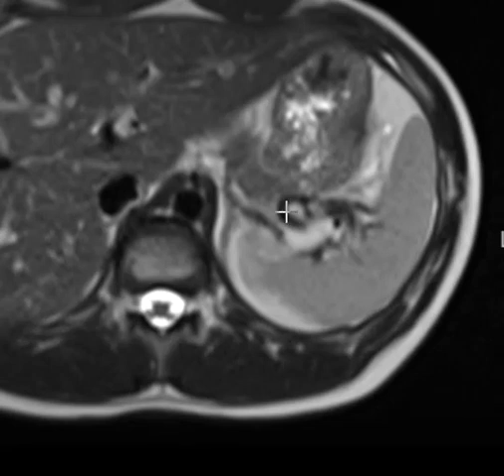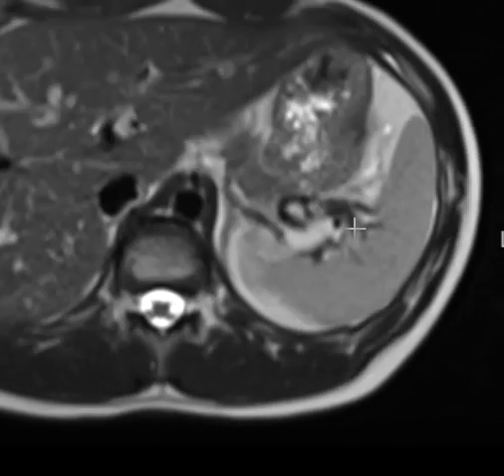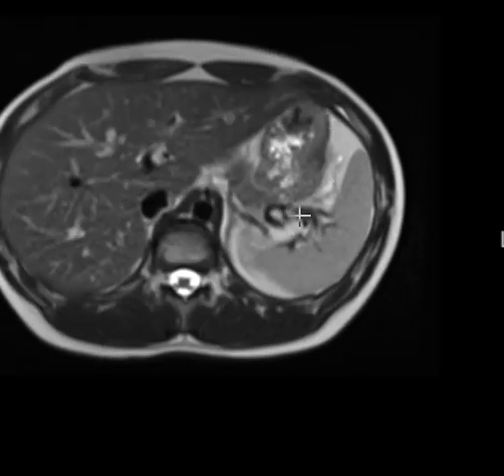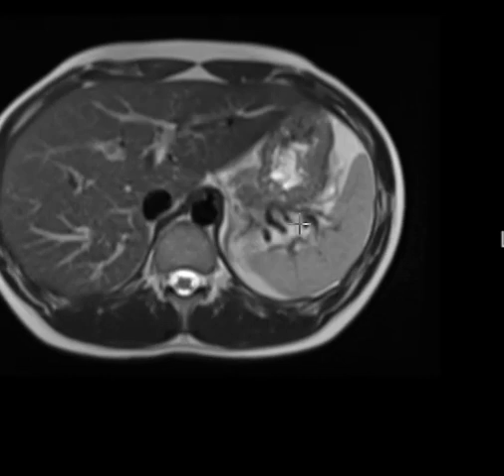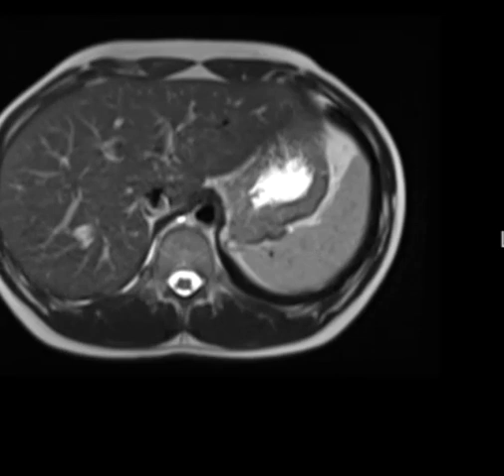We see these dark areas around it. These are the blood vessels. Most of these are the veins. Sometimes when people have problems in their liver, if they have high pressure in their liver from liver disease, these veins can be dilated because the veins will flow out into the liver. And so we look at those veins to see if they're dilated. When they have liver disease, they can also get enlargement of the spleen as well. And in this case, a nice normal appearance of the spleen.